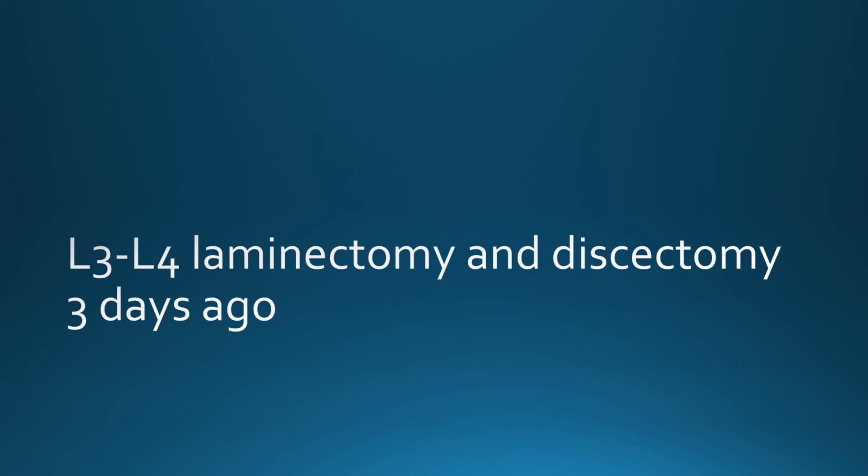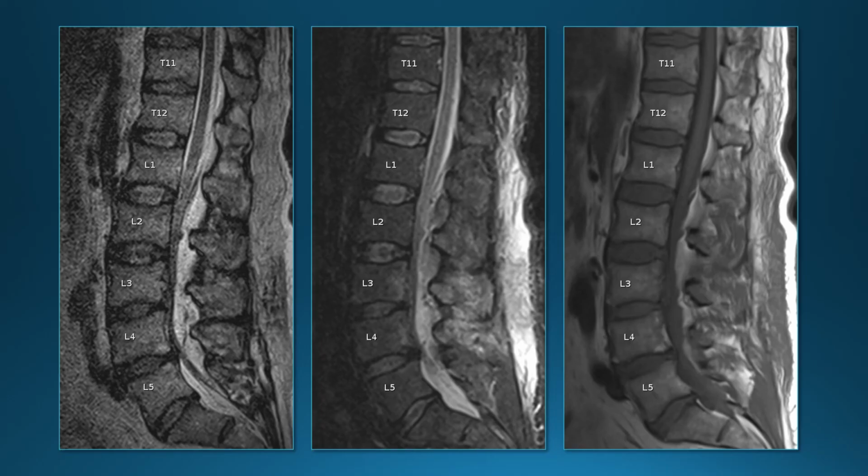This patient had a laminectomy and discectomy 3 days ago and presented with low back pain, had a lumbar MRI, and we can see this big fluid collection in the posterior epidural space. Here it is on the STIR and on the T1. Now, if you notice on the T1, some of this fluid has a bright T1 signal, suggesting subacute hemorrhage. And this was not an epidural abscess. This was a postoperative epidural hematoma.